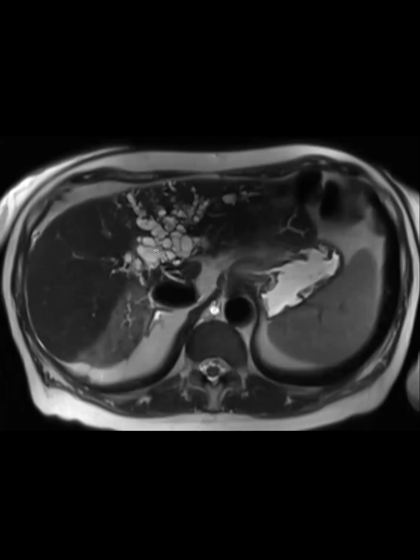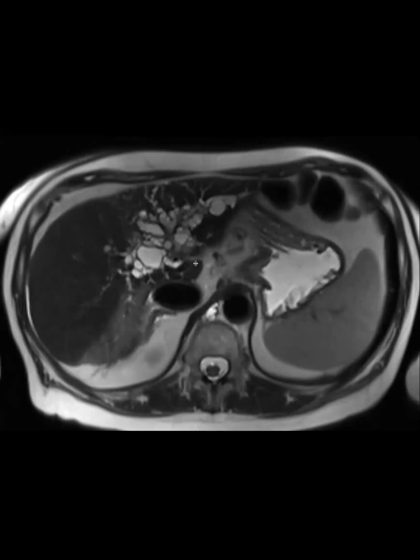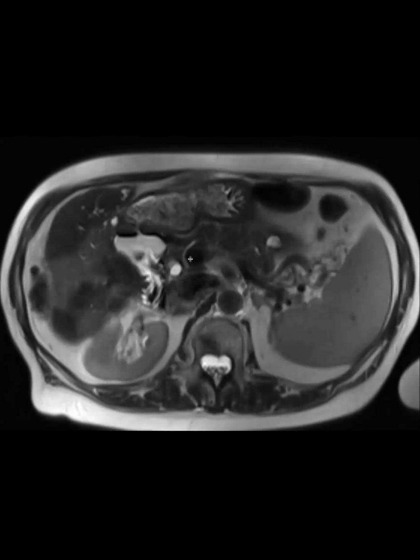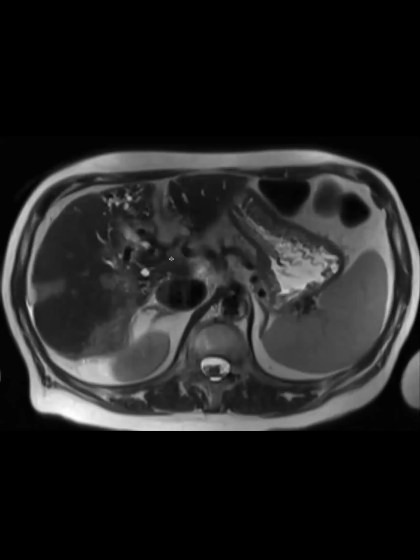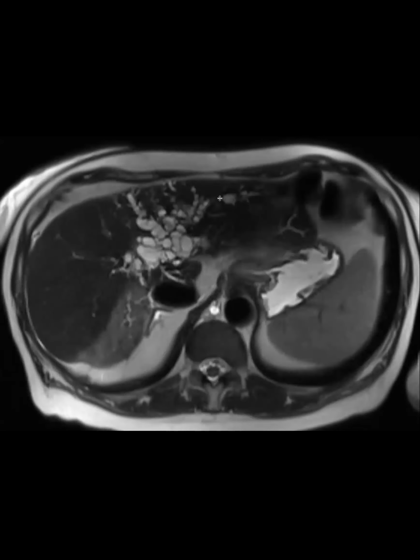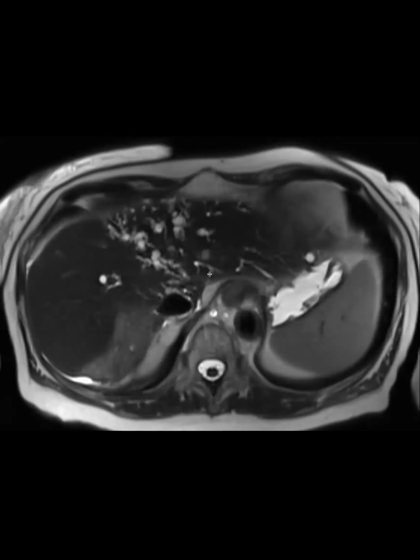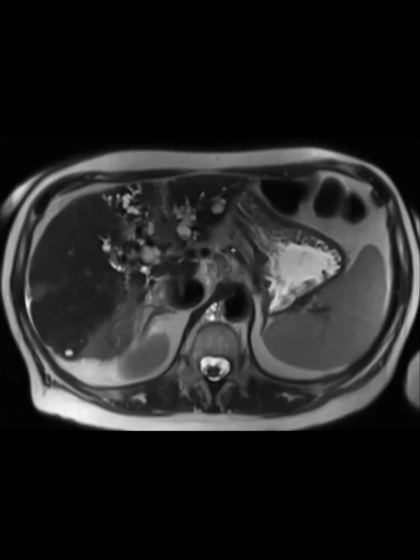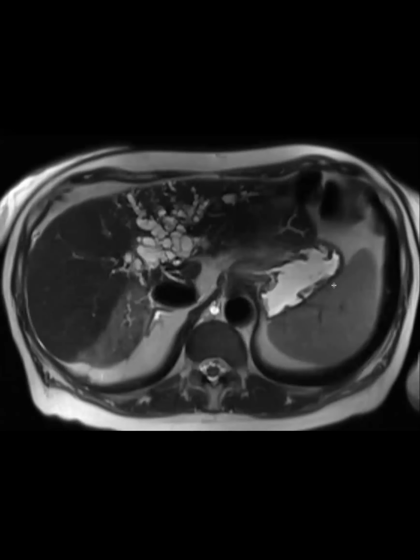This has not come out yet, so we don't have surgical path, but they did do Spyglass and brush biopsies, and each time it shows mucinous secretions, and they haven't seen any dysplasia or any evidence of malignancy yet. But it's a fairly large lesion. So in the future, if they resect this, it would be worth seeing if there is dysplastic tissue here or any malignant transformation. But so far, this has stayed as just an IPNB.